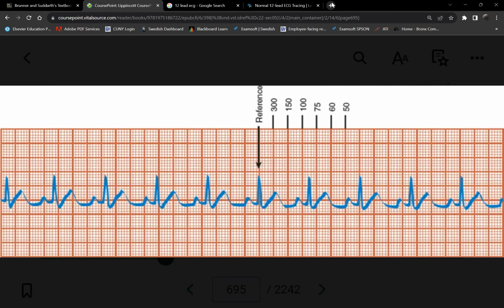Okay. So don't worry, because this is again an estimate. Nothing is accurate here because is this ever going to be accurate? No, because this is only 6 seconds. I need an entire 60 seconds for it to be accurate. Are we clear? All right. So that's one method.